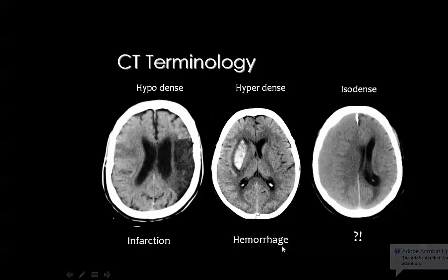Before we start, we have to emphasize some of the terminologies that we usually use while discussing this issue. This is actually for the junior staff, in order to set up some of the facts before going deep into this subject. Whenever we are dealing with the CT scan without intravenous contrast injection, we use these three terms.